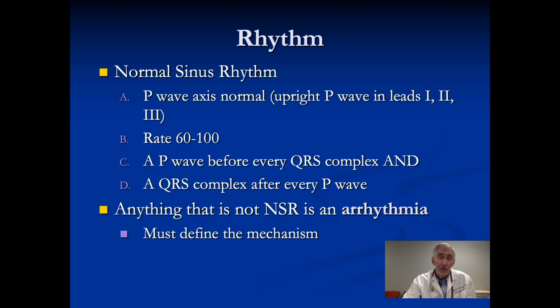Rhythm. How do we define sinus rhythm? You'll hear people say that it's a P wave before every QRS and a QRS after every P wave. But I want to dispel that concept, because really sinus rhythm is just the SA node firing and moving down the atria in a normal axis and then going to the AV node.